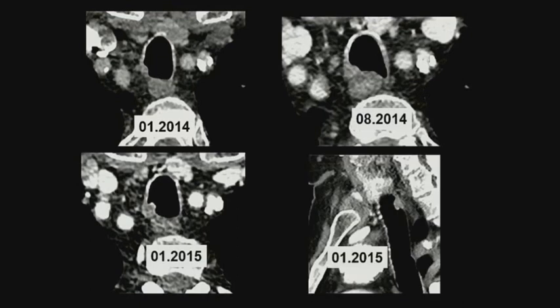This is another patient who has been first scanned due to an incidentally discovered pulmonary nodule. I think it was in the left lower lobe. And diligently, we invited him for a follow-up, and then for another follow-up. And only a substantial time later, when he came for his actual 1-year follow-up scan, we paid attention to the fact that there is a nodule within the trachea, which is growing slowly but surely between January of 2014 and January of 2015.